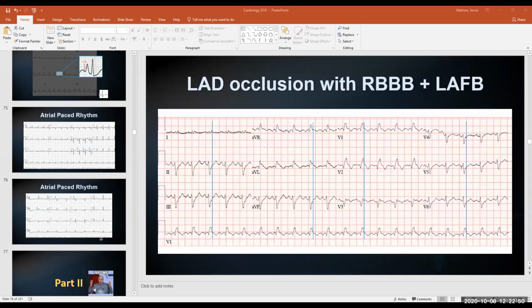So in this patient, I probably should have put this after I discussed the left anterior fascicular blocks, but here we can see that in V1, the QRS starts here. That was supposed to be a straight line and it wasn't. So it's clearly prolonged. It's going to be greater than 150 milliseconds. So we know this is a true block. And then we can see that it's very subtle, but it looks like there's somewhat of an upward deflection and then a down, and then the second rabbit ear is right here.